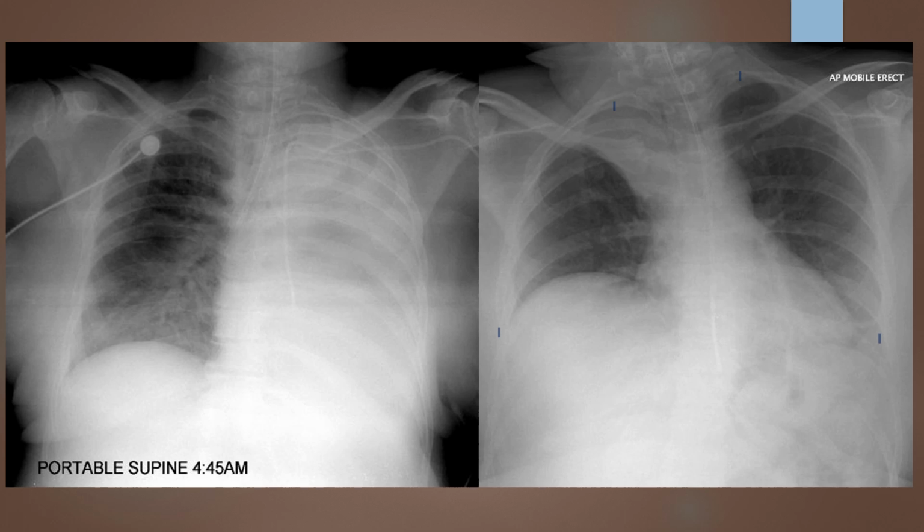Number 2, I'm going to look at my legalities. So patient name, facility name, date of birth or MR number, date and time of the exam. And we're going to assume that since this is an anonymized image, that those things were there. We're looking for our lead marker, which is not present on this. So that's a whole another consideration we need to take into account.